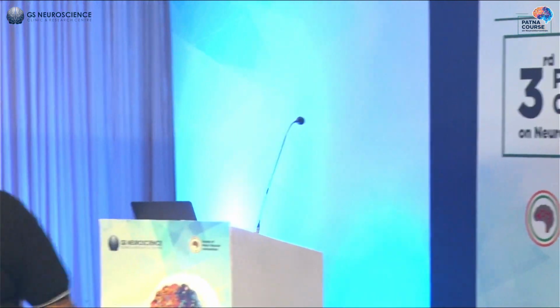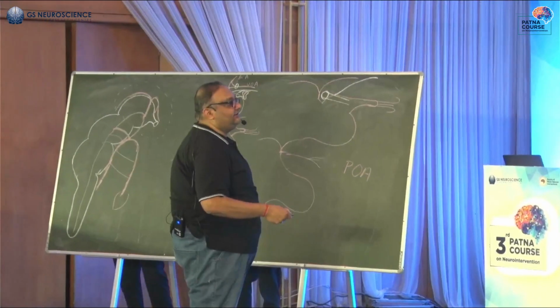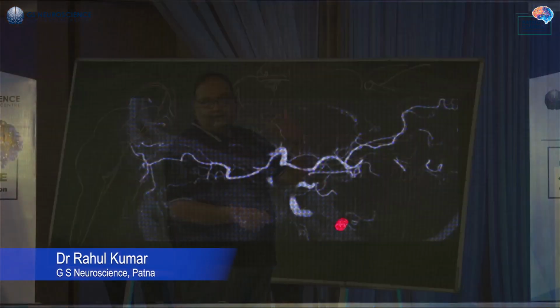Let's see if we can make this interactive. This is basically a cone beam CT exploration of the entire ophthalmic system. This is like a lateral view.